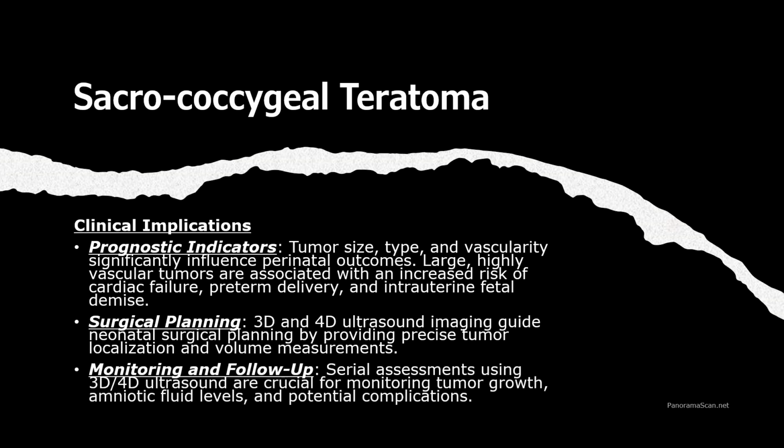Monitoring and follow-up with serial ultrasounds, especially using 3D and 4D ultrasound, are essential for monitoring tumor growth, amniotic fluid levels, and any potential complications. Continuous assessment helps ensure the best outcomes for both the fetus and the neonate post-delivery.